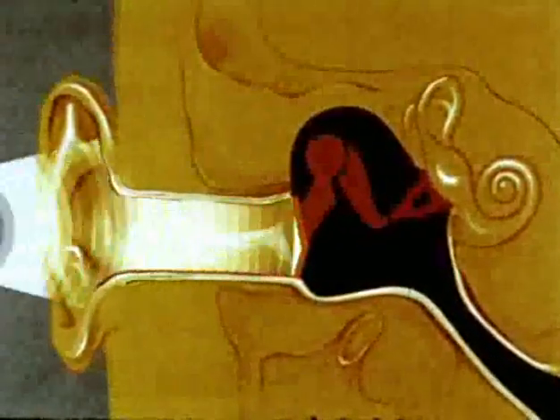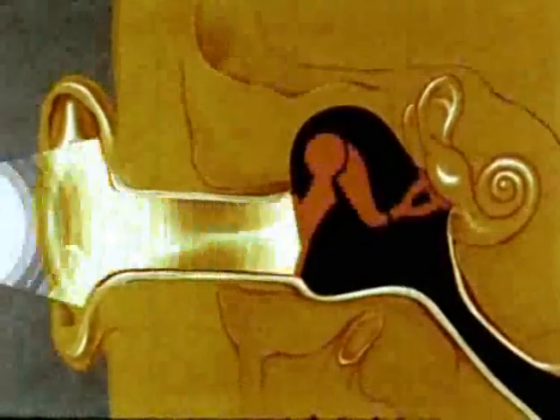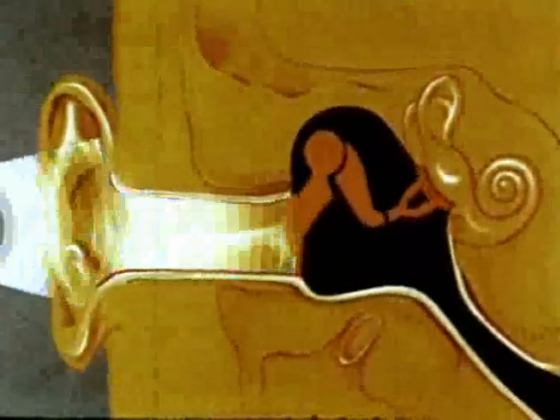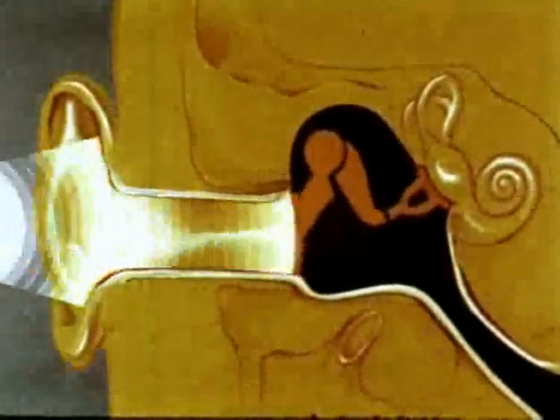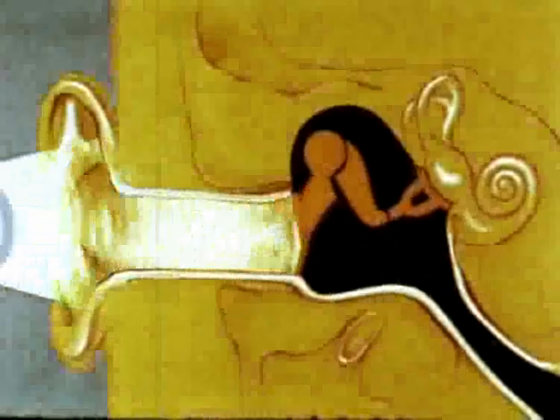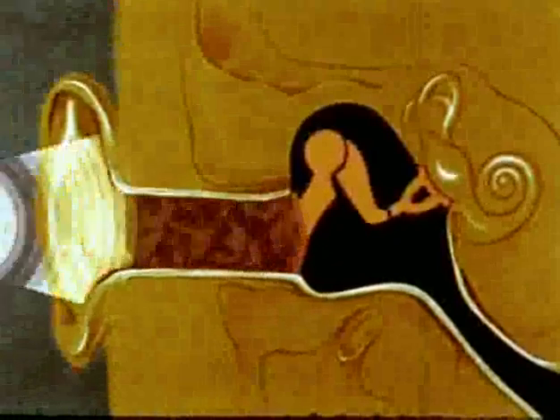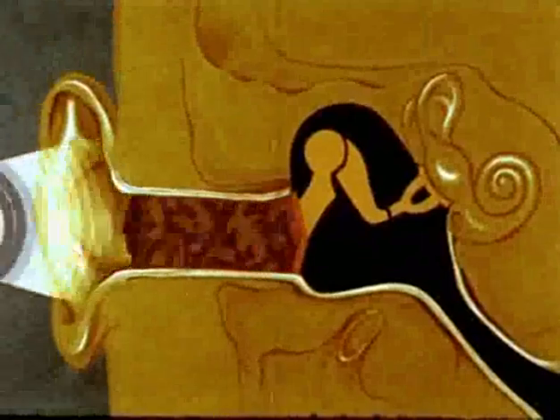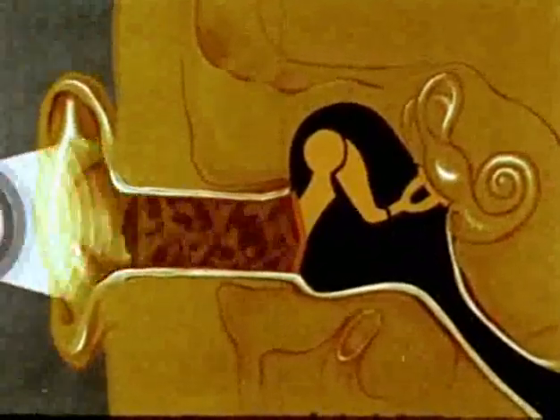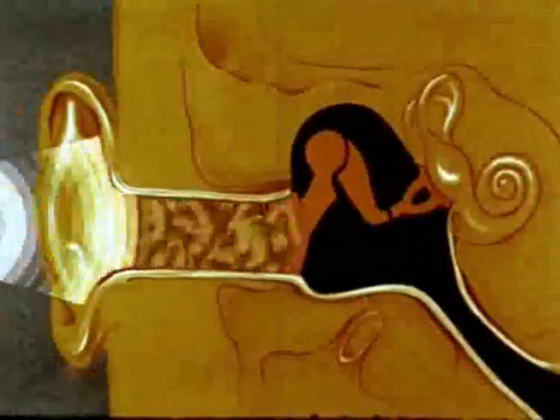In the normal ear, sound waves are conducted along the external auditory canal to the tympanic membrane. Most of the sound energy is absorbed by the membrane, setting it into motion along with the ossicular chain and thereby transmitting it to the cochlea. However, not all of the sound is absorbed by the drumhead. Some of it remains in the external canal. The normal ear absorbs much sound and is said to have a high compliance to sound, or a low acoustic impedance. Conversely, an ear which absorbs little sound has a high acoustic impedance and a low compliance.